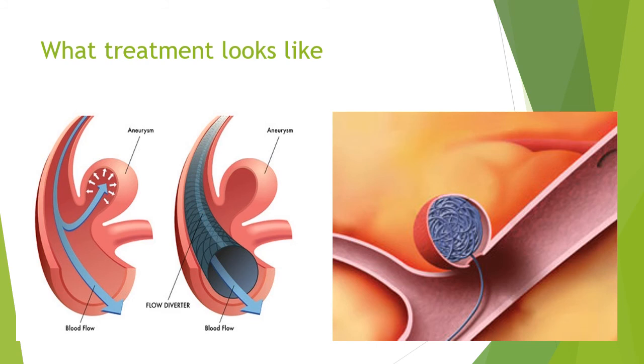On the left, a stent is led by a guide wire to the side of the aneurysm, and the stent prevents blood flow from reaching the aneurysm, preventing it from bursting. On the right, a coil is guided into the pouch of the aneurysm, and the coil is bunched up so that not as much blood can enter the site to cause the aneurysm to rupture.